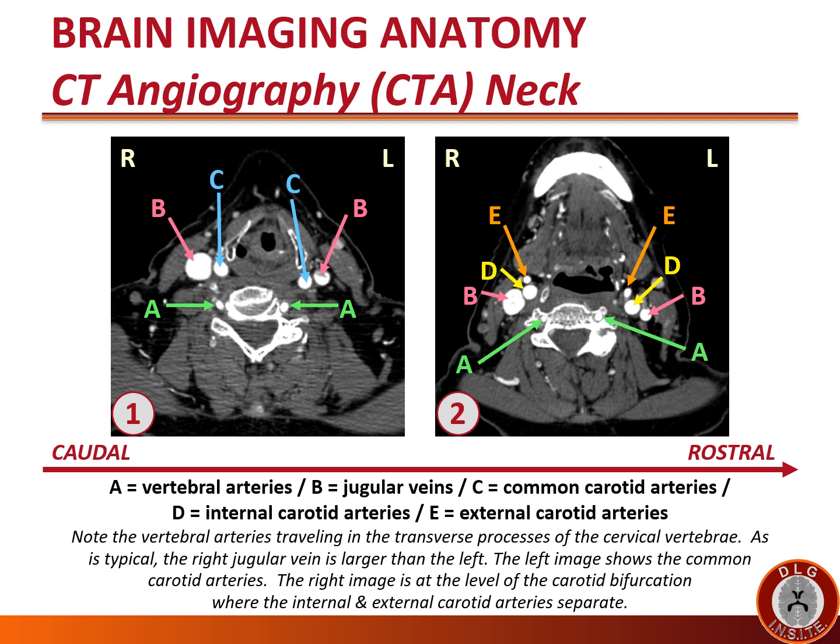The left, more caudal image shows the common carotid arteries. The right, more rostral image is at the level of the carotid bifurcation, where the internal and external carotid arteries separate.